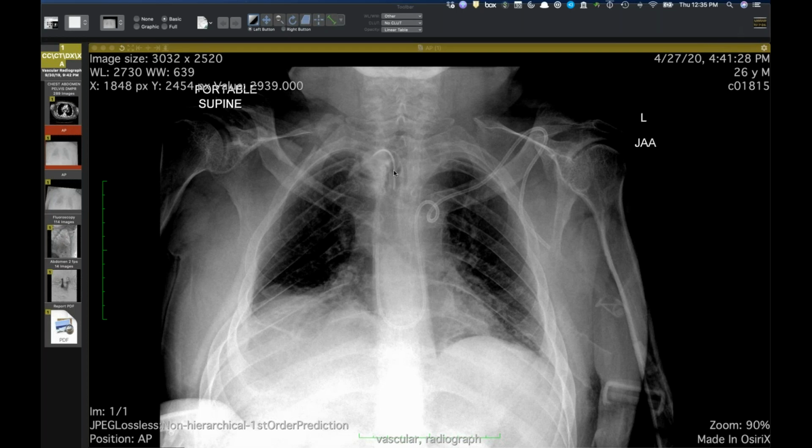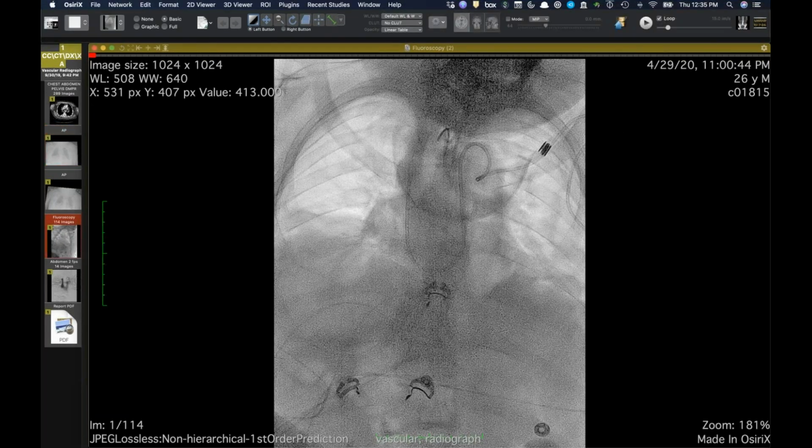This patient has a tracheostomy, and so they've got long-standing illnesses. They're fairly young, but have had multiple indwelling catheters and had this peculiar course. And when I first looked at this, I was wondering if this is some weird pigtail catheter, but of course then you see it continues along and goes down and then back up. So just in a general sense, could be some sort of venous, extravascular, or unlikely to be arterial in this case.